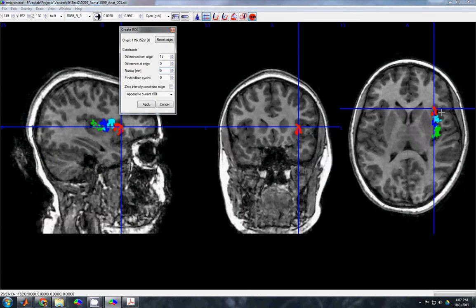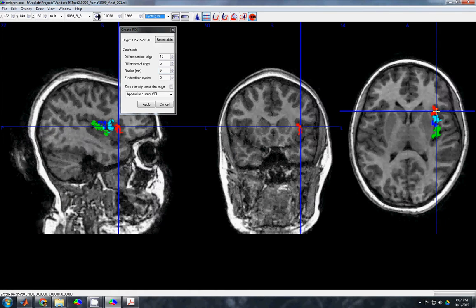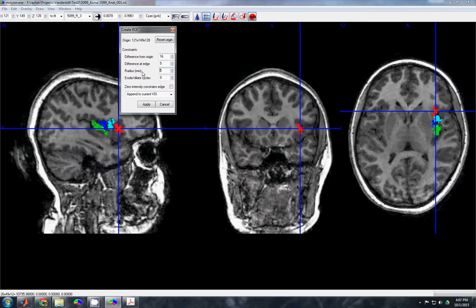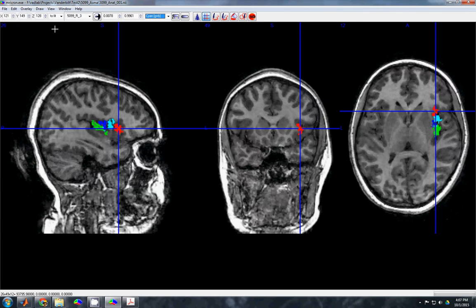Yeah, not bad, not bad. Okay. As I move all the way out to the surface, I can see it's mostly filled in at the surface where there shouldn't be a lot of white matter. So I like that. I'm pretty happy with that.